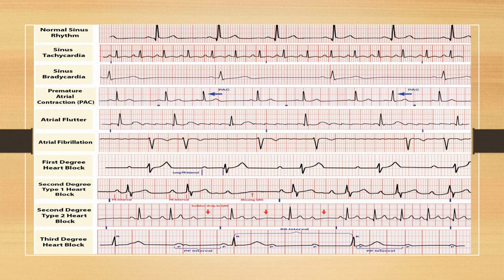So then the ventricles use their automated pacemaker and they beat really slowly at around 20 to 30 beats per minute. Okay, so that's third degree heart block. That definitely needs a pacemaker. These patients come in dizzy, collapsing, they're falling over because their blood pressure is dropping.